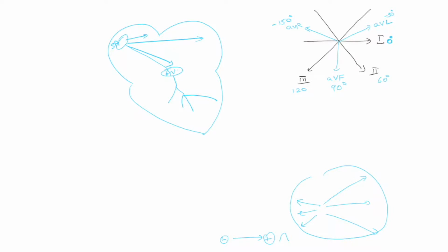Similarly, if you look at all the waves of depolarization in the atrium, all of them translate into one vector with a general direction about that. And the normal axis is typically between 0 and 75 degrees. So if you were to draw this wave, because it's between 0 and 75 degrees, you would expect it to create a wave that looks like that in lead 2, because lead 2 is 60 degrees. A wave of depolarization between 0 and 75 would be moving towards it, and hence the positive deflection.